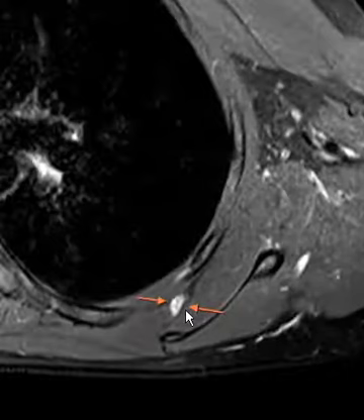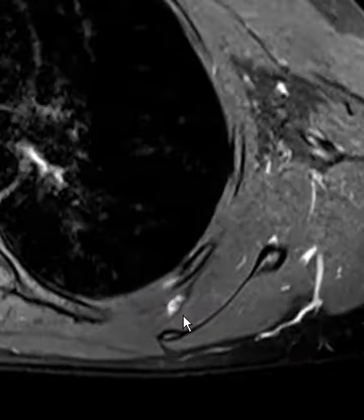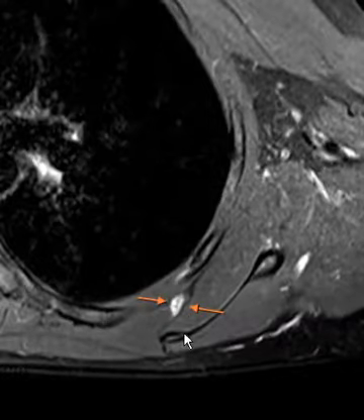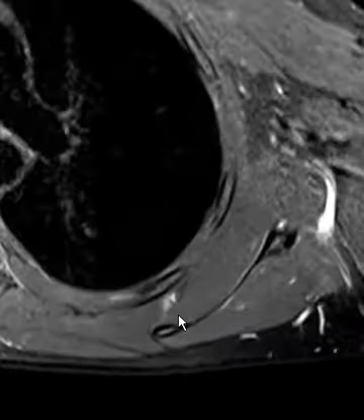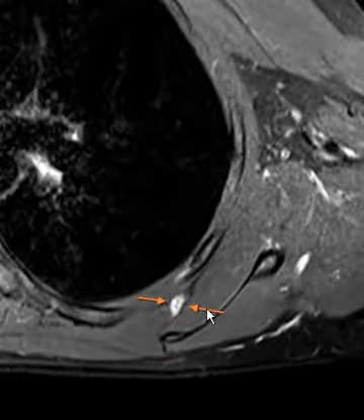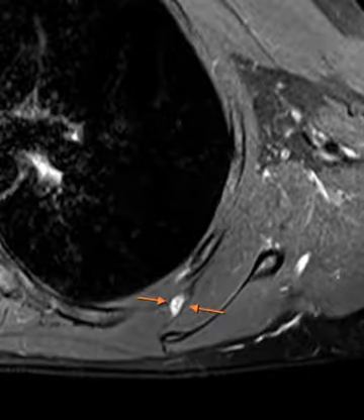We have a localized process here. Looks like a little localized inflammatory pseudomass along the medial margin of the scapula, inferior medial margin, and it's right over those ribs. So this is a classic location to have an Elastofibroma Dorsi, which is an inflammatory pseudomass.